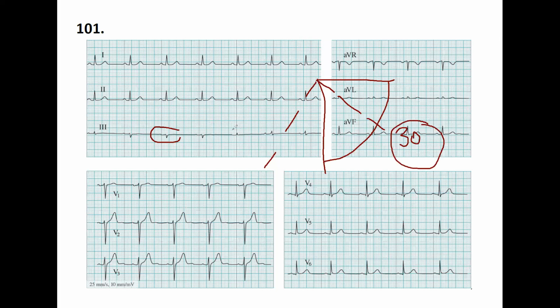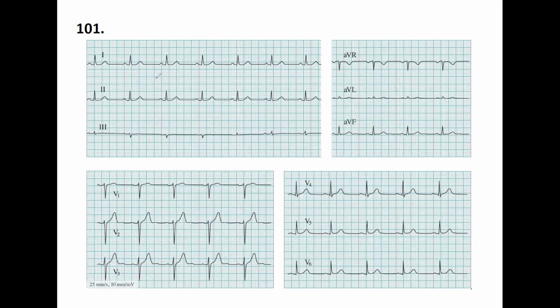That's another way that you can get to this point as well by looking at the size of the QRS complexes. Okay, let's look at it that way. First of all, let's choose which is the biggest one. Okay, 1 and 2 is about the same. What does it mean? Lead number 1 and lead number 2 is the same. When can it be? If the axis is exactly located in the middle. In that case, lead number 1 and lead number 2 should be the same. So again, the axis is 30 degrees.